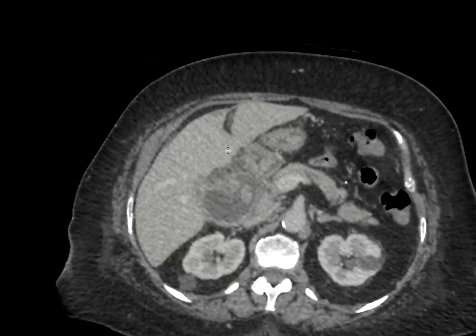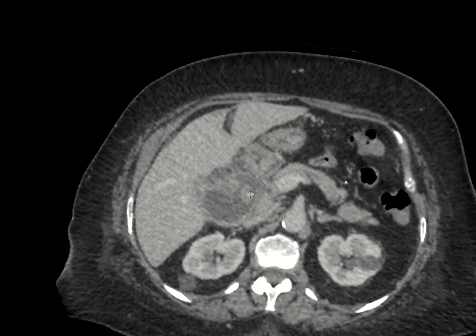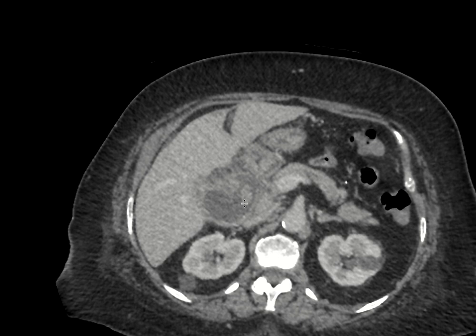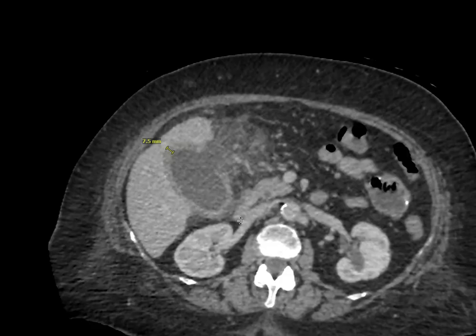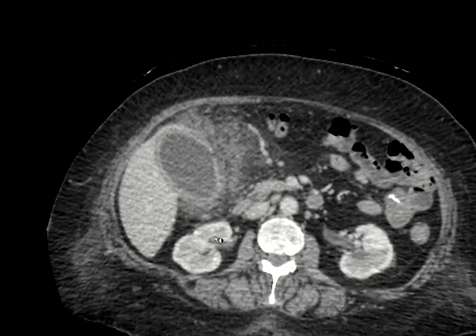And so this is a patient, you can actually see the gallstone here. Those aren't always going to be calcified. In fact, sometimes you're not able to see them on CT, but in this case you can see it. So there's an obstructing stone within the neck of the gallbladder that has led to acute cholecystitis, and then that eventually becomes gangrenous cholecystitis and then eventually perforates.